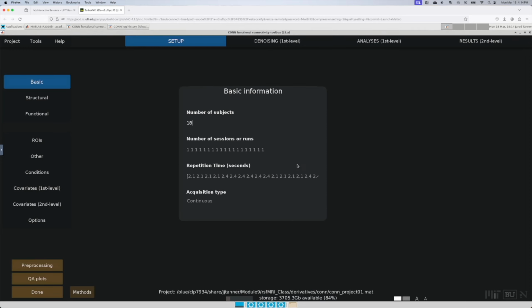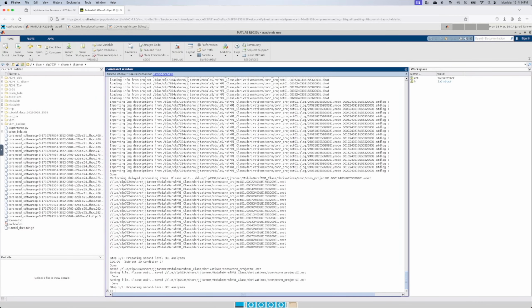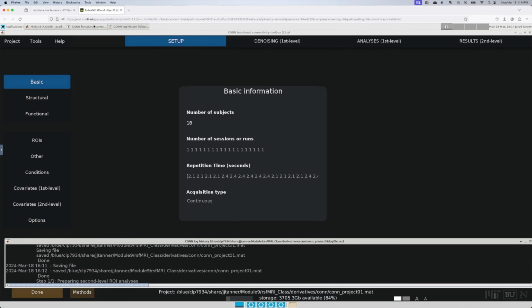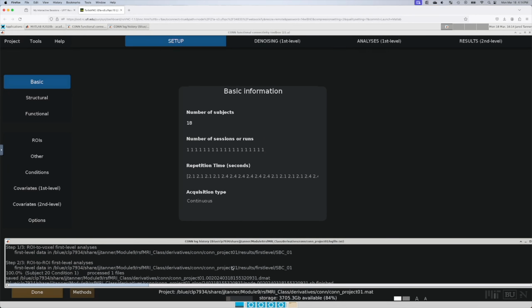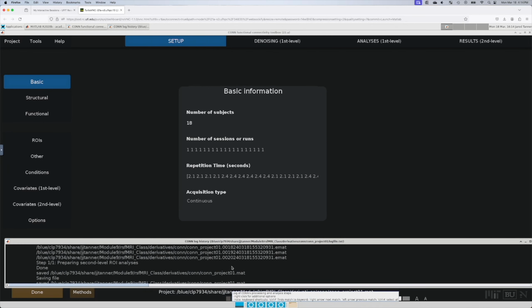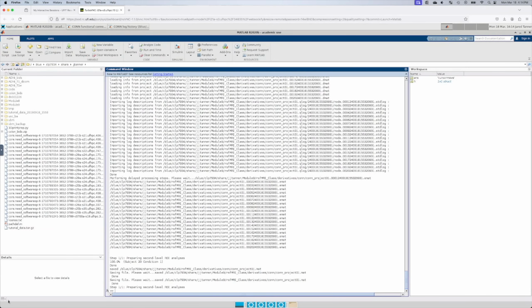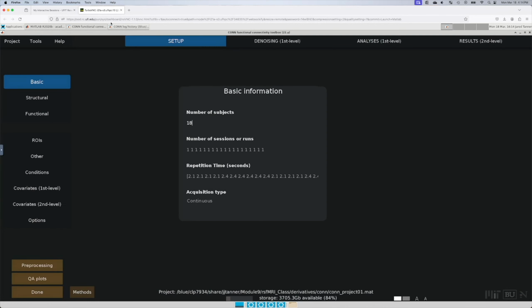Again, this is going to take a little bit of time to do. It probably took about 5 minutes for it to do everything. You can come over here and see steps. See if this is actually doing anything. There, we're getting this back in the main MATLAB window. It's saying busy. So we need to wait for that to not be saying busy anymore. Those will take a little bit of time. So again, I'm going to keep doing this back and forth.